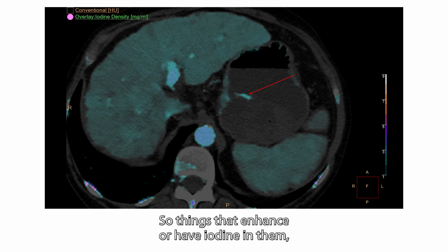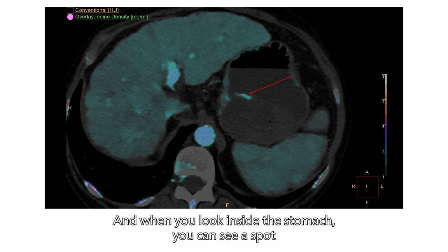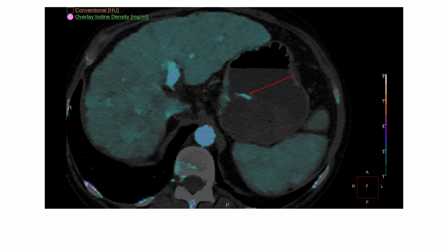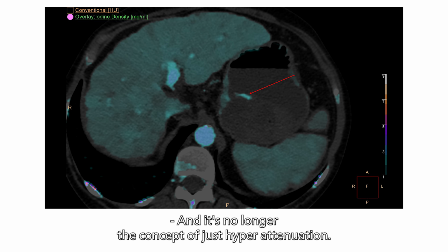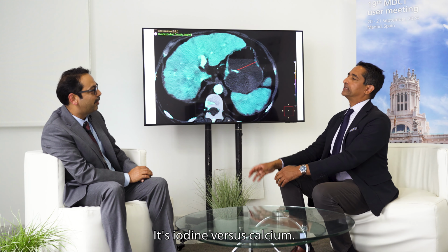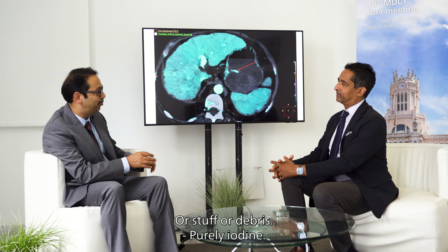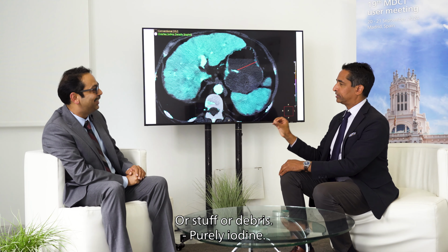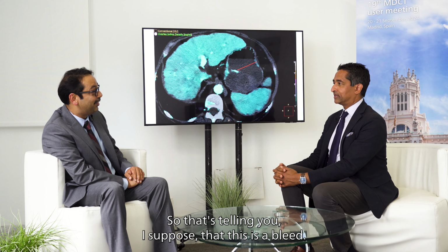display. So things that enhance or have iodine in them, and iodine is the contrast that you get injected, light up. And when you look inside the stomach, you can see a spot where there is clearly, it's lighting up with iodine or contrast. And it's no longer the concept of just hyperattenuation. It's iodine versus calcium, or stuff, or debris. It's purely iodine. So that's telling you, I suppose, this is a bleed.